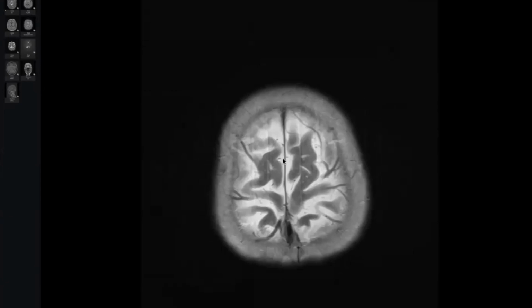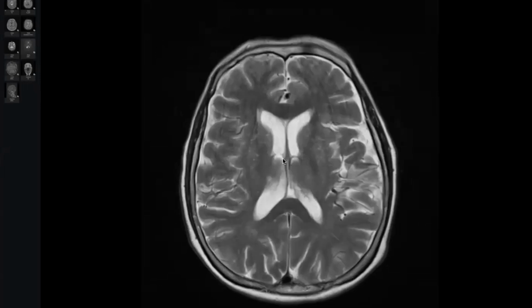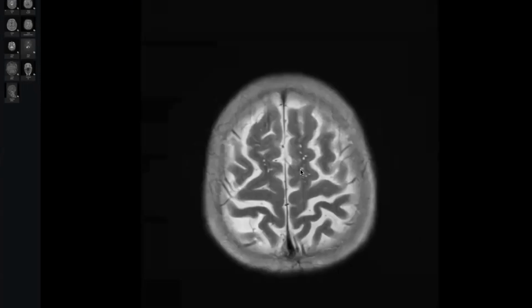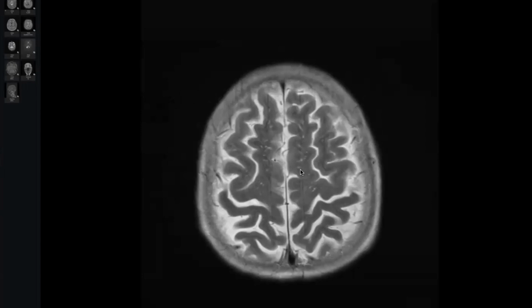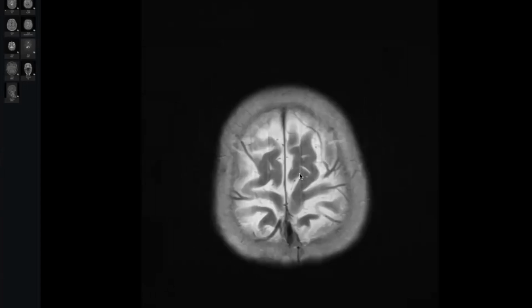One of my Vivas was subarachnoid hemorrhage, and the pathology was here, the last one. The examination was a little bit cut, not a complete examination, and there was an AVM here at the last cut.